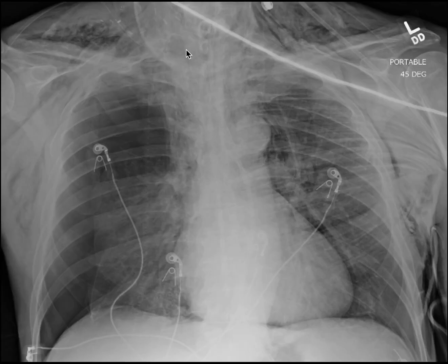Now, at the point that this x-ray was shot, you know that this patient needs emergent bilateral finger thoracostomies followed by chest tubes. But in terms of troubleshooting the actual tracheostomy, what you do is you think about two things always in this scenario. Number one, obstruction, and number two, displacement or dislodgement. And the way you assess for that, and it sounds like that was done very adroitly in this situation, is you feel for air movement over the tracheostomy tube, in and out. And that was done here.